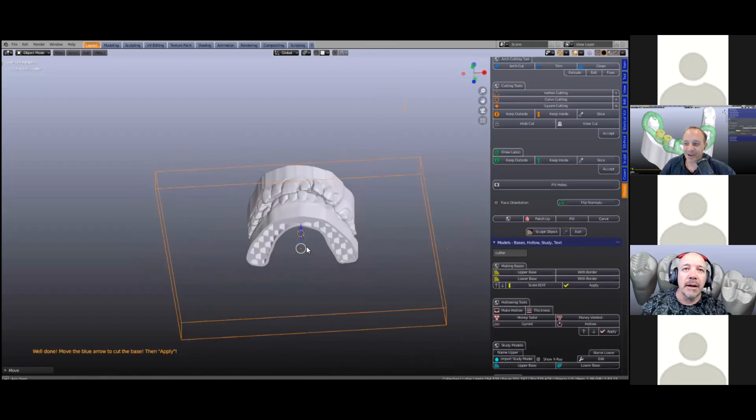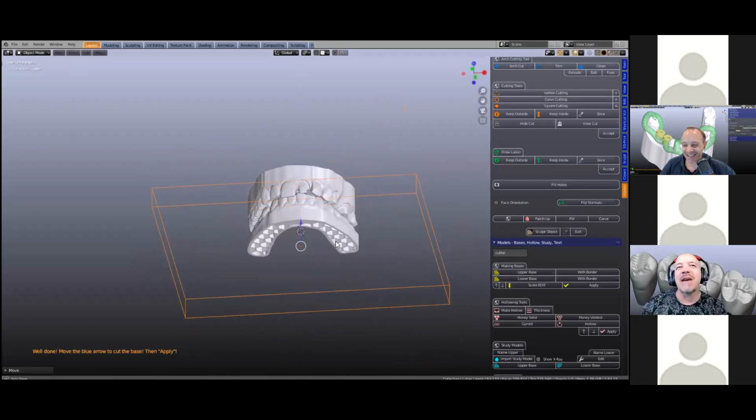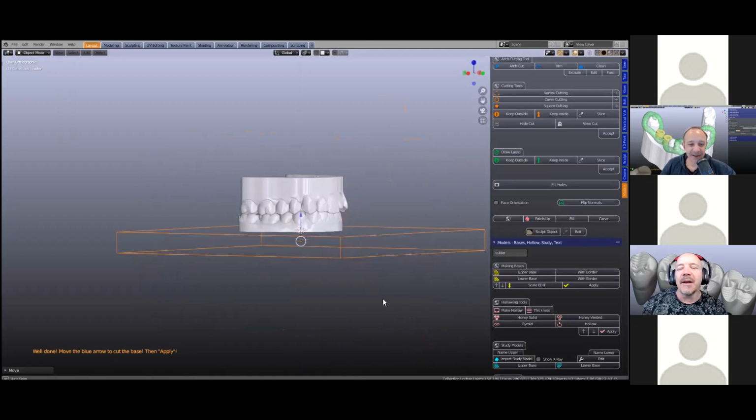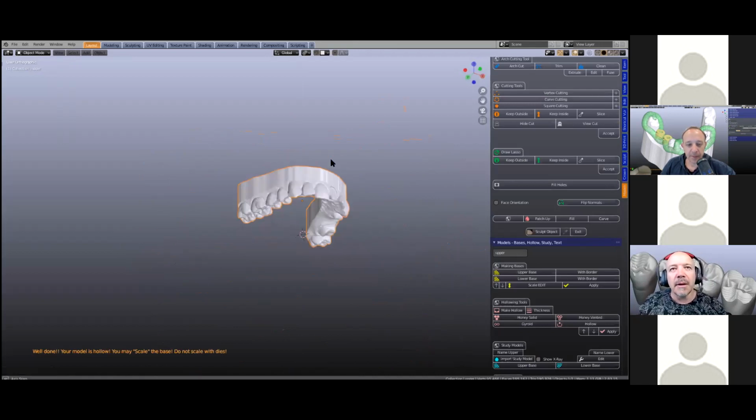Kids do it, for example, at the traffic light, when you're impatient, you click it. All right. So we're going to just click on apply, and then we'll go into making the die. I'll just hide the lower one. Okay.